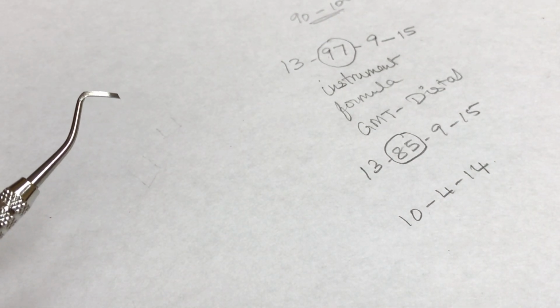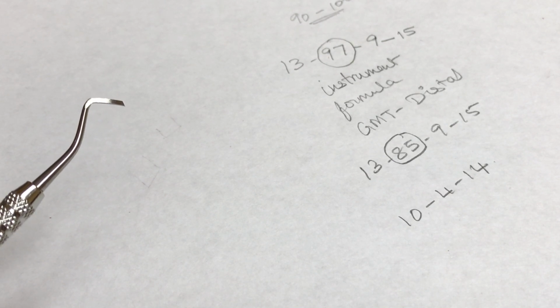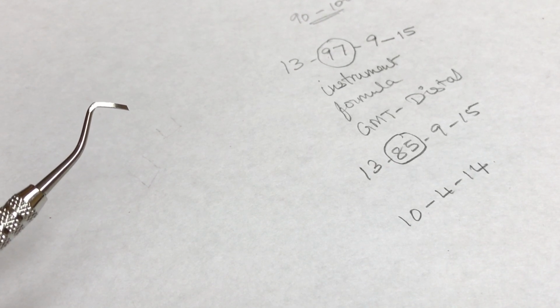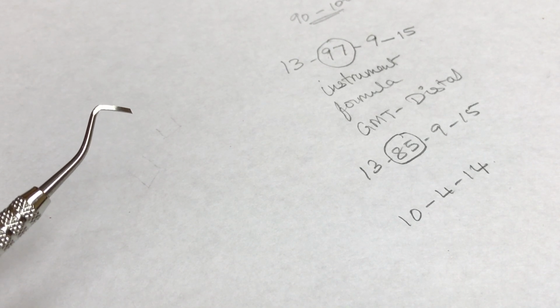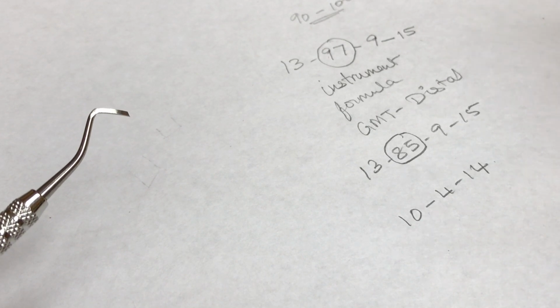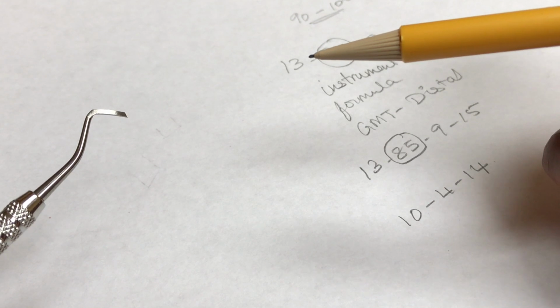That would be the easiest way of identifying, because not all companies that manufacture the same instrument show the instrument formula in the same way. Sometimes they have their own instrument numbers which they imprint on the instrument, hence you cannot really figure it out at the exam hall by the instrument number. So the best way is to see where the tip of the bevel or the cutting edge is, and based on that you can decide if it's a mesial or a distal margin trimmer.